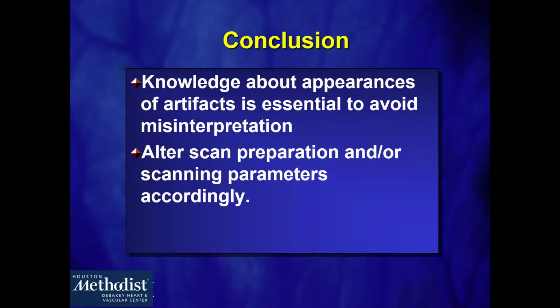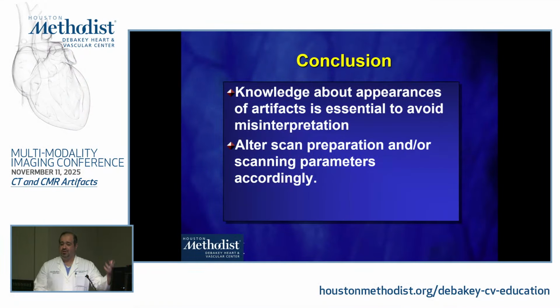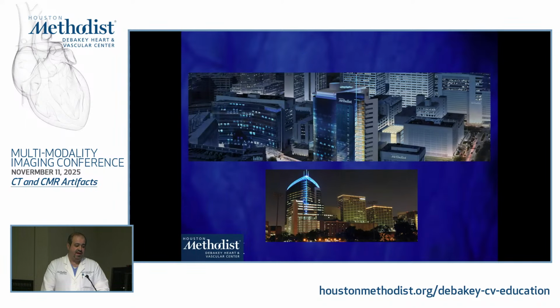In conclusion, knowledge about the appearances of artifacts is essential, because we do not want to misinterpret an image, whether LGE or CT. Altering the scan parameters, and making sure that for every scan you do, you look at it and verify whether the quality is adequate, yes or no, and if not, what happened at the time of acquisition, is really going to be mandatory in these cases. Happy to take any questions.